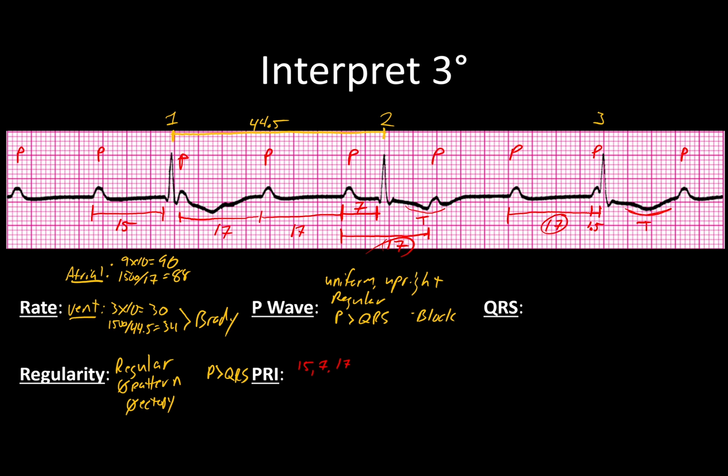You talk about how the QRSs and the T waves are overlapping or the QRSs and the P waves are overlapping one another. All of that just adds up to being wildly inconsistent, no pattern, and no reset.